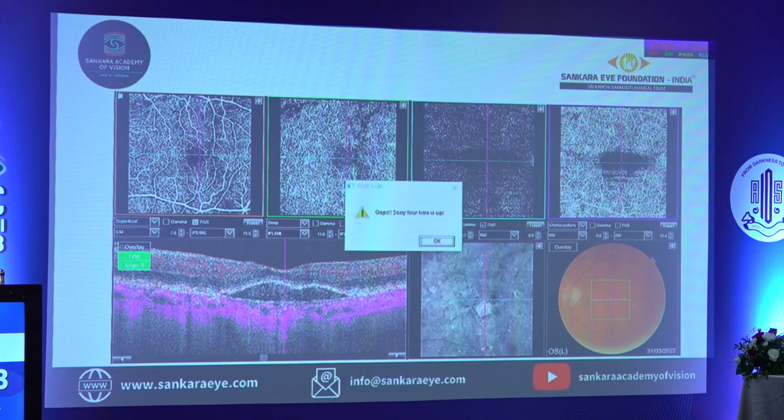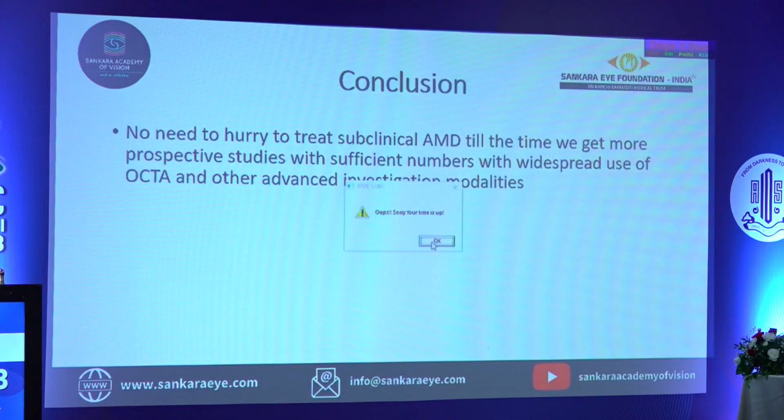For reference, I have shown another patient who had frank AMD in the other eye, and this eye showing a subfoveal RPED, but there is no neovascularization. So I conclude by saying that there is no need to hurry to treat subclinical AMD until we get more prospective studies with sufficient numbers, with widespread use of OCTA and other advanced imaging modalities. Thank you.